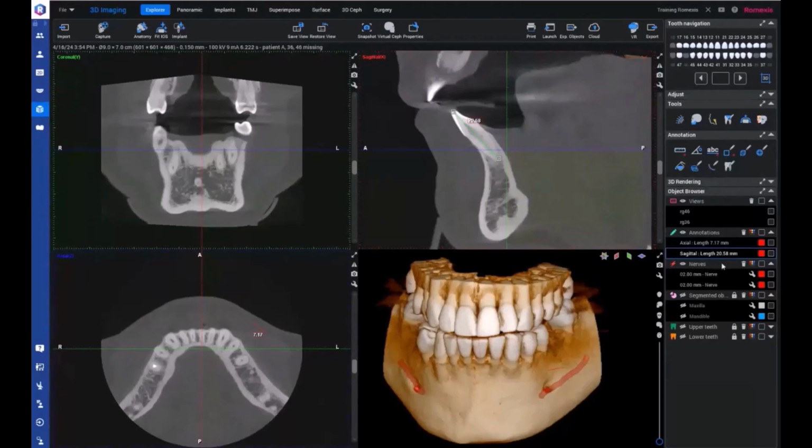So that is automatically done. And we also, like you can see here, there's also this views category. So also if you don't want to do any annotations to remember and to save that view, you can also save views, and that then happens from here.